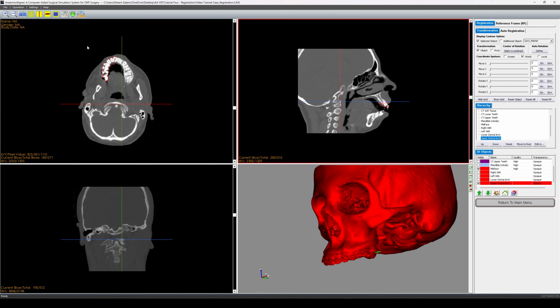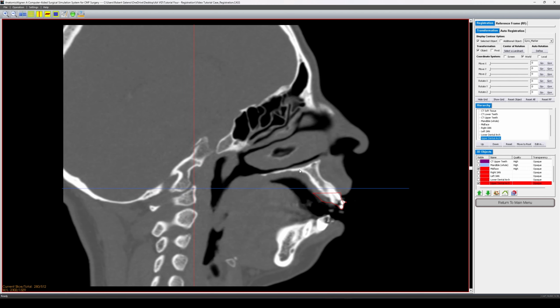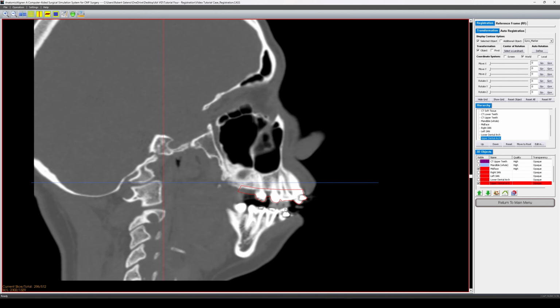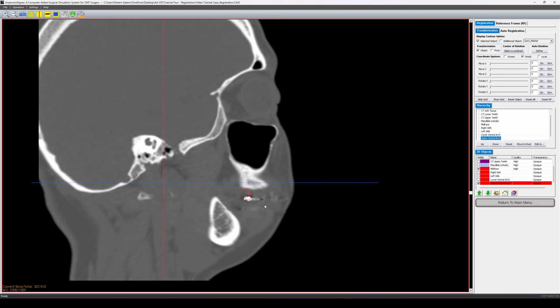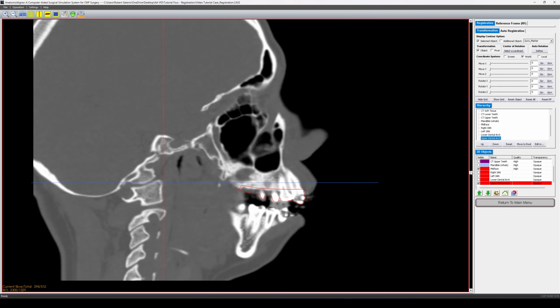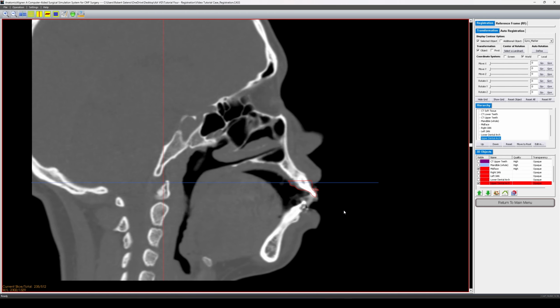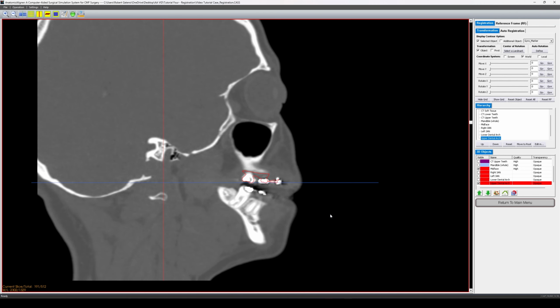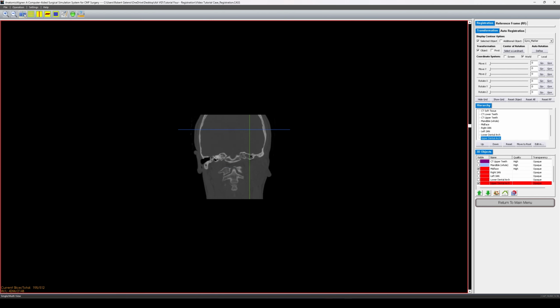Let's first look at that contour in our sagittal view. We can zoom in, and let's scroll throughout our slices. We should be pretty vigilant about this to make sure that contour aligns with the teeth. This looks pretty good. Let's look in the other direction. This all looks pretty good so far. Yeah, nothing is glaring. Let's confirm that by looking at our coronal view.